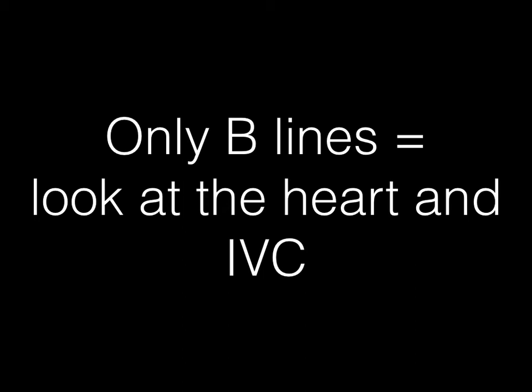So again, the take-home point from B-lines is that there is a differential diagnosis, know the criteria for them, think about where they're located, and when you see them, think, well, do I need to look somewhere else as well? Okay, with that being said, let's move on to something that I love looking at, and that's looking for pneumonias.